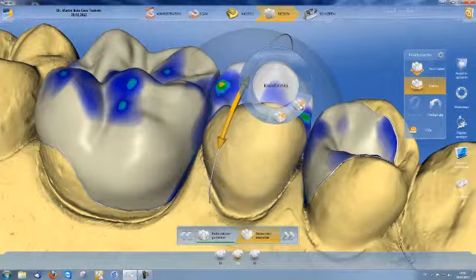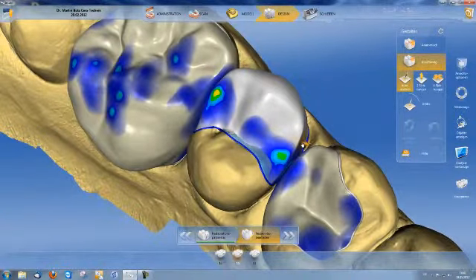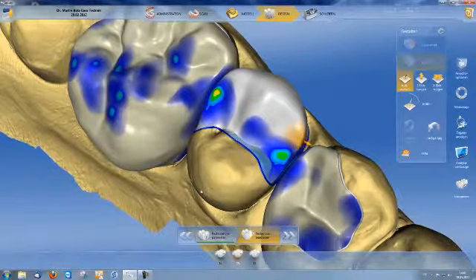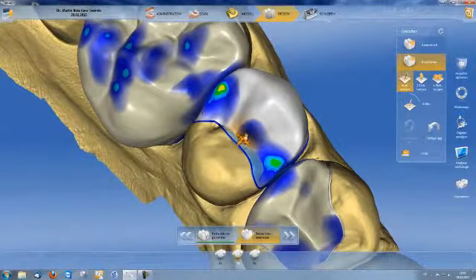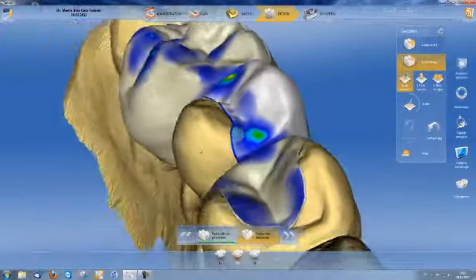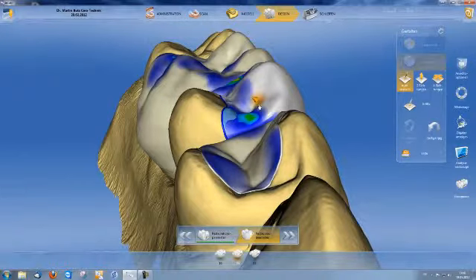With right-click Anatomical Circular, I can now always build up the anatomy as I require. The minimum wall thickness is visible again here. It may be worthwhile to move the fissure slightly to prevent any conflict with the minimum wall thickness. Small area to possibly also build up fissures.